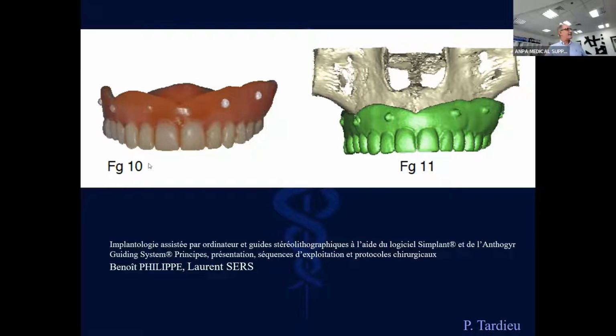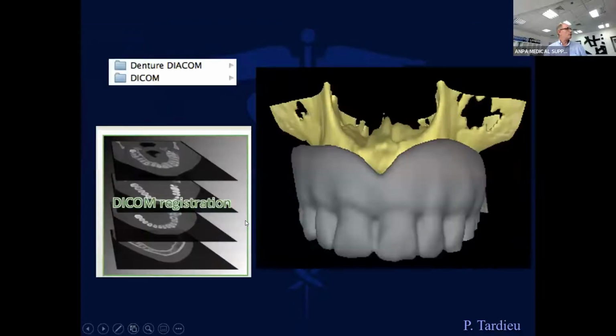And then we take a second CT scan, and this is the second CT scan of the denture itself. You see you have some gutta-percha points here, 1, 2, 3, 4, 5, 5 or 6 is enough. To avoid the gutta-percha falling down like this, I make a small 2 millimeter deep hole, and I ask my assistant to make small beads of 1 or 2 millimeters, and I put the beads inside of the gutta-percha, which is much more stable than how it has been shown here. So then we go to the next step.